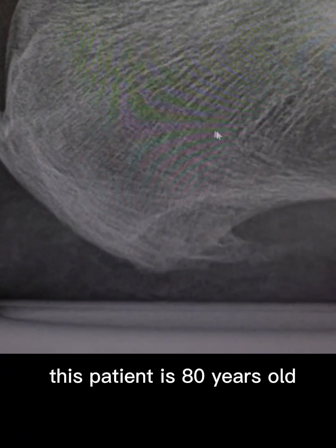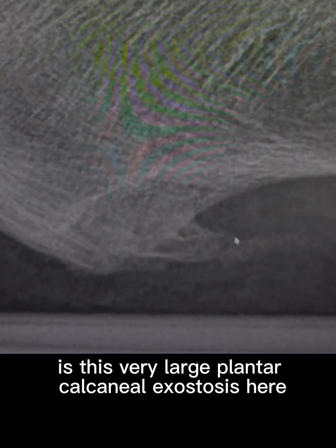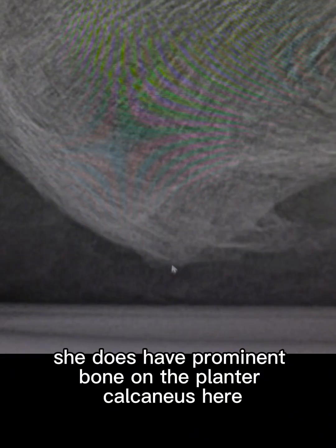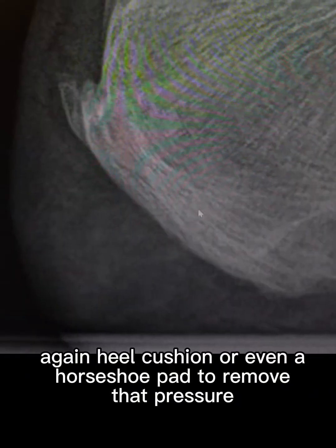This patient is 80 years old and she presented with heel pain off and on for many years. Most notable for her here is this very large plantar calcaneal exostosis here. This had some trauma in the past where the spur has broken off and calcified even further. She will end up with a massive plantar calcaneal exostosis. Also notable, she does have prominent bone on the plantar calcaneus here and a weaker fat pad here. There's not a lot of space between here and the bottom of the plate. She'll need accommodation to support this and take pressure off here. Again, heel cushion or even a horseshoe pad to remove that pressure.